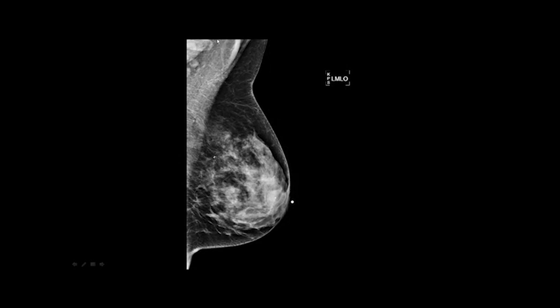I like this image, wide superior convex border down to the level of the nipple. She's very dense. There's IMF here. Just pretend there's not a clip here. But the nipple's in profile. There's a tiny fold in the muscle, but not bad. I like it. This would be something I would send in for the ACR.